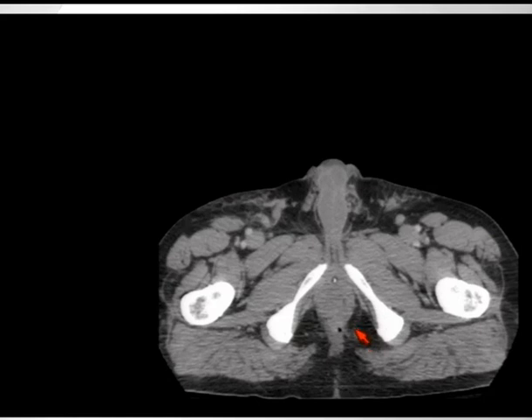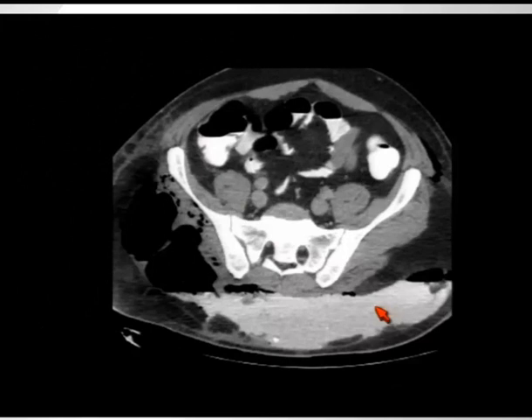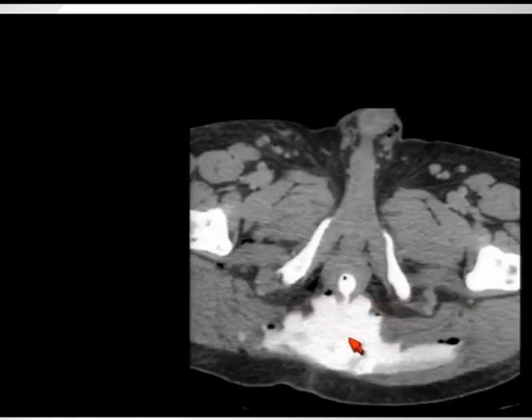of this exam, but the patient was admitted to the hospital because he had suffered additional injuries, and during the hospital stay developed sepsis, high fever. We repeated a CT examination and noticed there's a very large gas leak and rectal contrast leak that was originating from that initially missed small rectal perforation. So attention to detail in patients who have evidence of significant abdominal injury, such as an abdominal wall hematoma or an adrenal hematoma, should increase our suspicion that there may be one of these easily missed important injuries, such as rectal or bowel trauma.